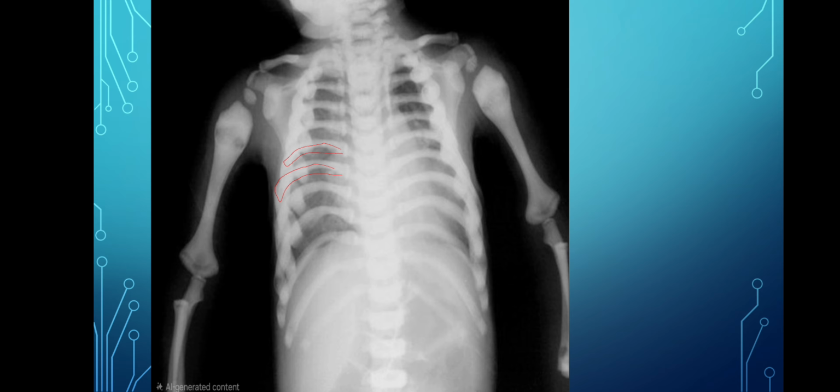This is a diagnosis of osteopetrosis. If all the ribs are normal but the lateral ends of the bones have a radio-opaque shadow, a white density on the lateral end of every bone, then it is Caffey's disease. But in this case, the white density is in every bone, so it is the diagnosis of osteopetrosis or marble bone syndrome.